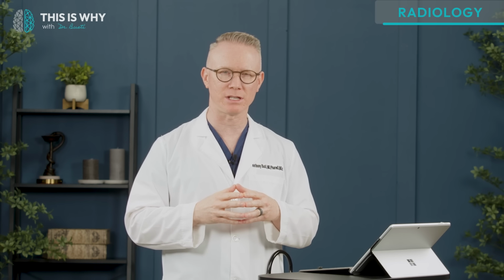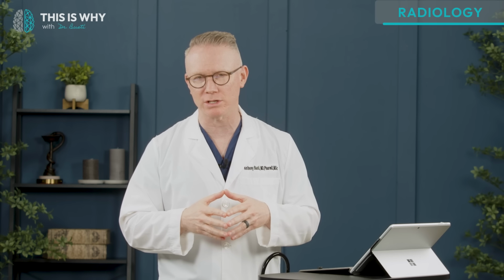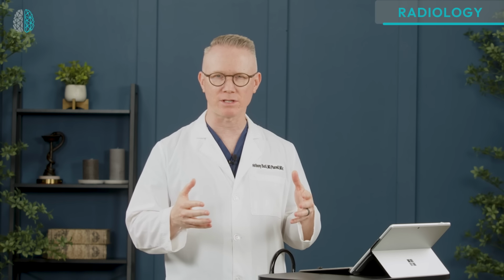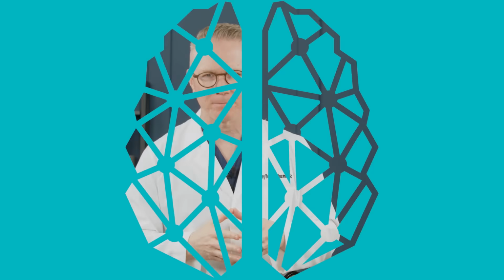Furthermore, the skills help ensure accurate diagnoses in certain clinical settings, especially with portable AP chest x-rays, which are commonly used in hospitals for bedridden patients. Those patients are at higher risk for poor inspiration and rotation, which can mimic and even hide pathology. So rib counting verifies if the image is adequate for interpretation and is commonly used in the mnemonic that I teach about, which is RIPE, R-I-P-E.